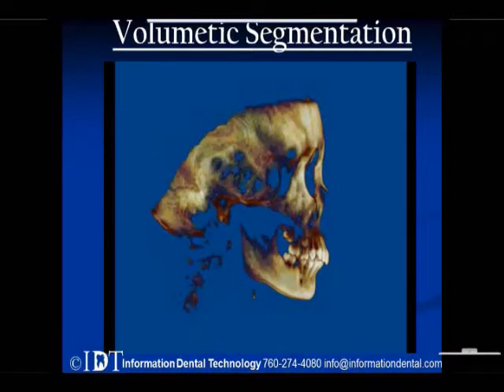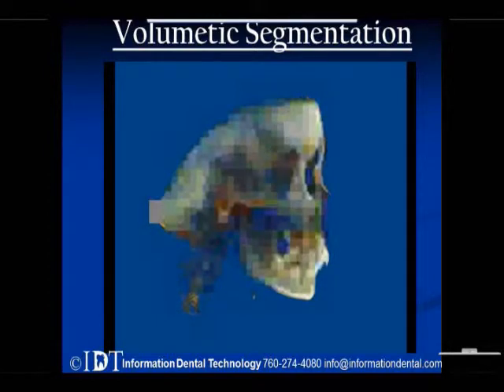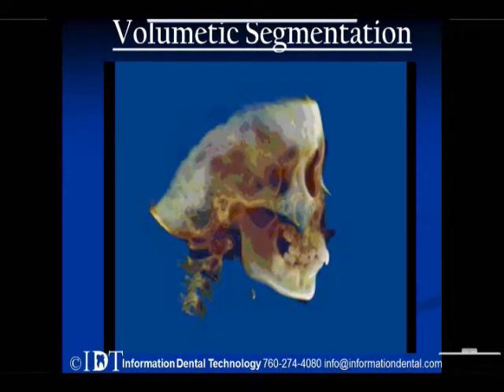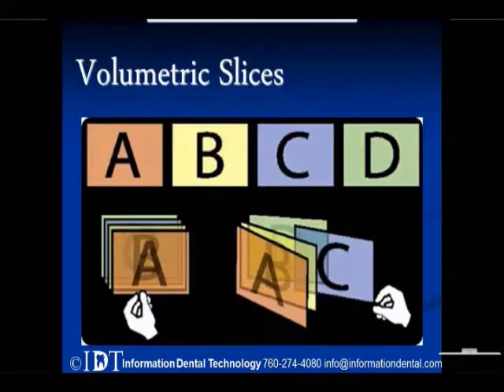The 3D model is great mainly for a few purposes. If you're placing an implant, you can see the trajectory of the implant coming through the restorative space really clearly on the 3D view. You can also determine parallelism between two or more implants, and the 3D view is great for that. So there are a lot of very useful tools in the 3D view. But you don't want to use it exclusively, especially when you're looking at the surgical aspect of treatment planning. For that, the two views that I use the most are the axial view and the volumetric slices, or the cross-sectional views that I spoke about earlier.